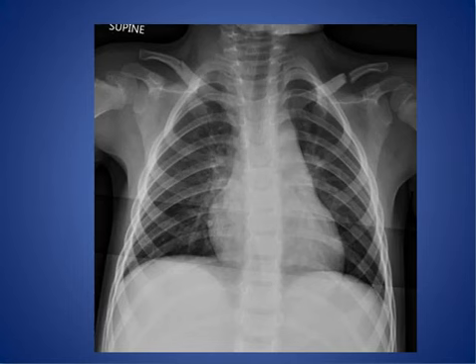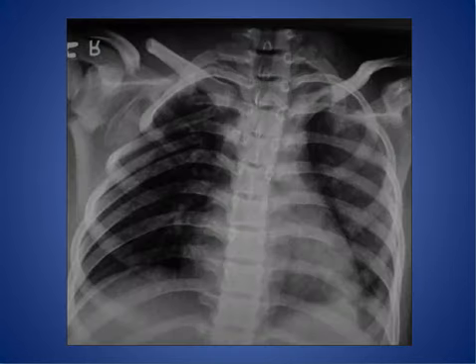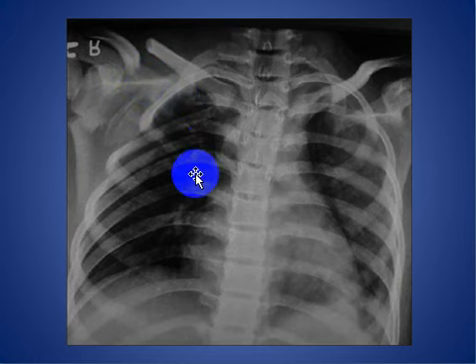Here, this patient has bilateral clavicular fracture in this supine chest X-ray, more pronounced on the left side. Here is another patient with fractured clavicle with displacement of this part in relation to the rest of the clavicle, and this is also associated with fracture of the scapula and multiple rib fractures and right-sided pneumothorax in this supine film.